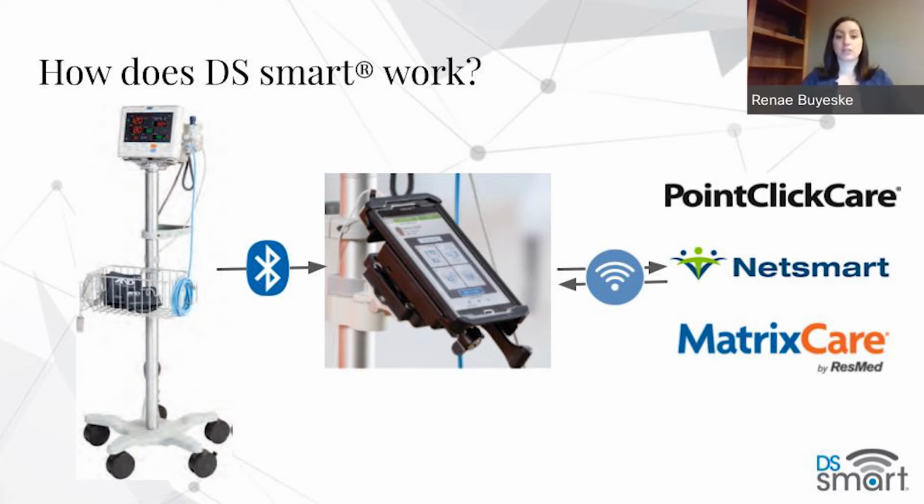In addition, we also see that this tablet is mounted directly to the vital sign monitor itself. This mounting solution is optional, but gives you the capability to permanently and securely lock that tablet in place and permanently keep it with the vital sign monitor for the benefit of having everything all in one. I grab my vital sign monitor from the nurse's station, and as I go down the hall, I have everything that I need in order to grab, capture, and send that data into the EMR. That sending the messaging of the information from DS Smart into the electronic medical record is done via Wi-Fi.